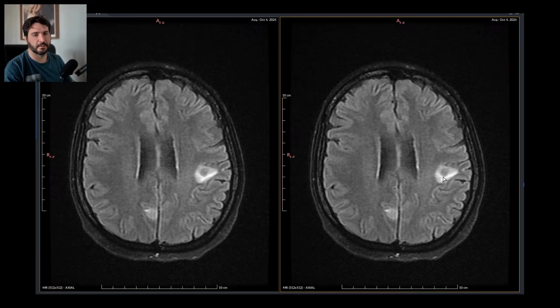I'm just going to measure this, 0.8, and this is a 1.0. So let's grab a normal template for starters. Normal template. And delete the diffusion weighted sequence and the non-enhanced lesions sequence. And let's describe the lesions. So they are solid, intra-axial, they have peripheral edema, and they enhance. This is it.